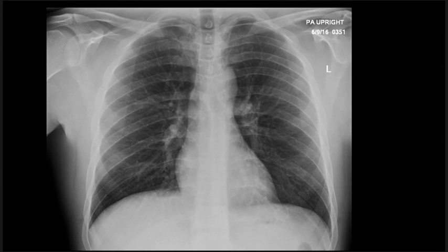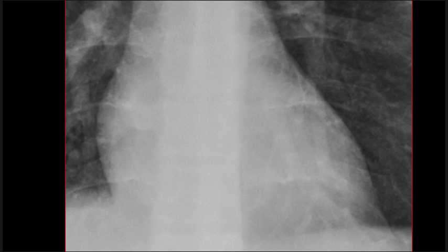Alright, so this is actually the normal study that I showed earlier when I was talking about that normal right heart border. This time I want to take a look at the left heart border. This is very subtle, but I'm going to use it to illustrate a point that it's always sort of there in one degree or another, but when this finding is present in a more extreme end of the spectrum, then it can create some problems. So the right heart border looking very sharp and normal, like we could draw it with a pencil. Left heart border also pretty sharp, except for this part down here. It sort of gets blurry down there, right? Like, okay, well, that's no big deal.